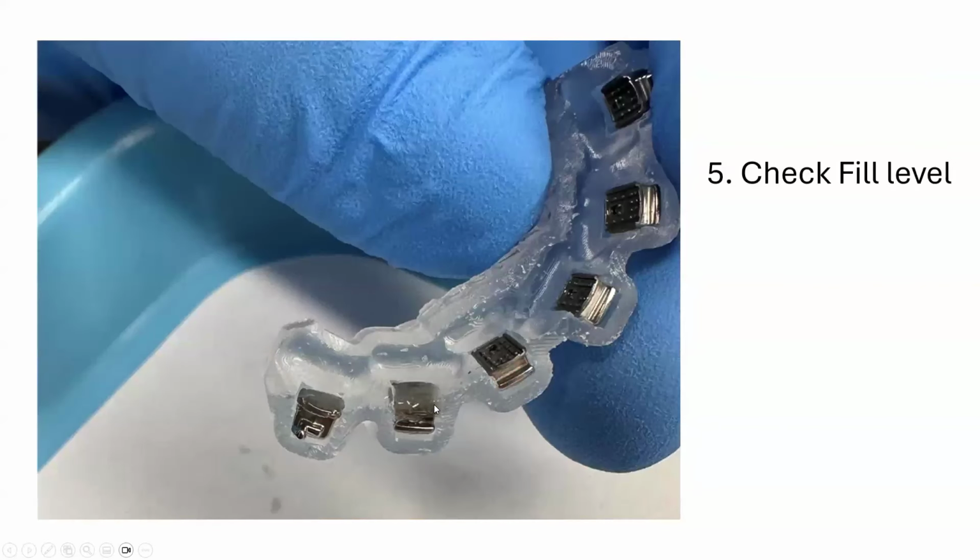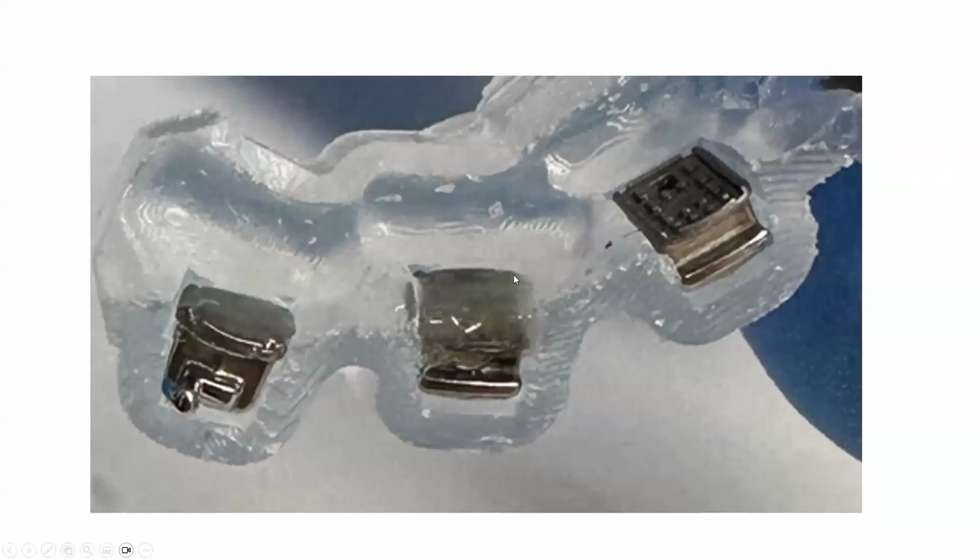But do you see this slide right here? If you look close, you can see the surface of the tooth and how big the wedge is before you get to the pad of the bracket. Does my mouse show on this, Ryan? It does. Yep. Right here, you can see the bracket, adhesive, your bracket on top too might be a good way to visualize that gap.